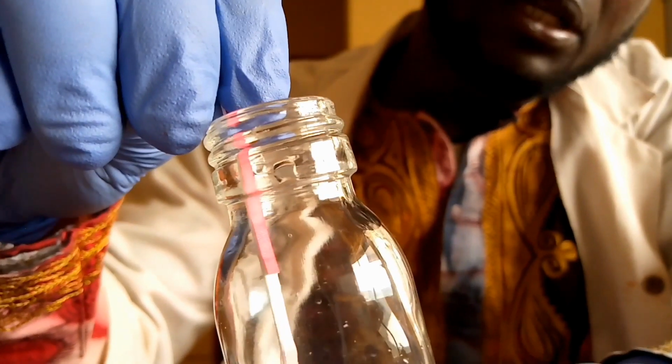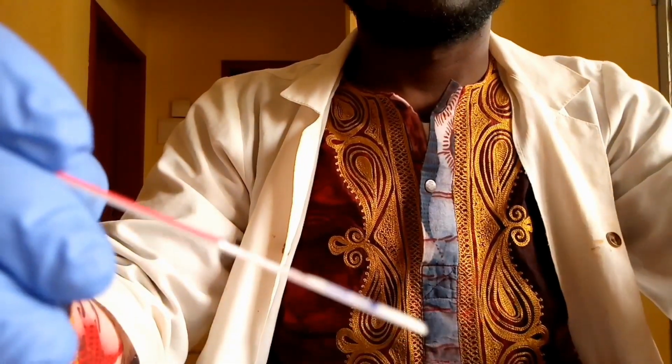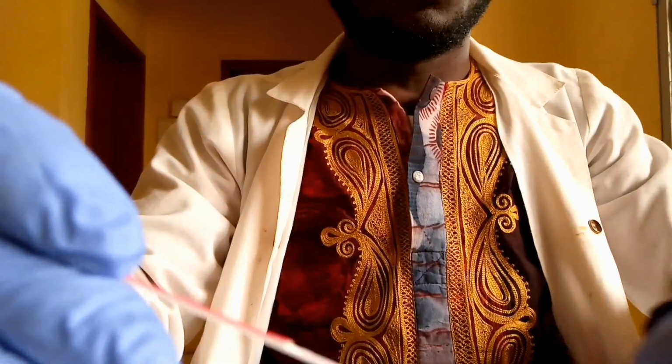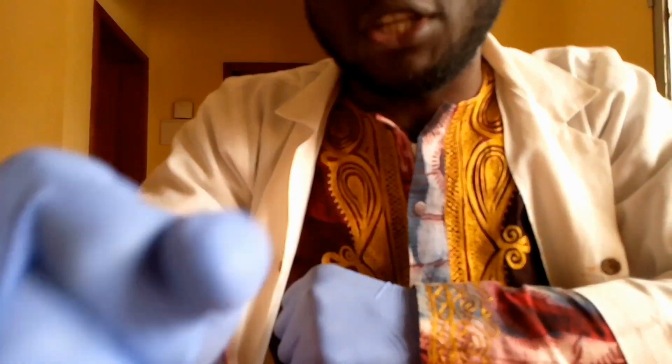No problem. So you can remove. Then you keep your test strip to lie for 10 to 15 minutes.